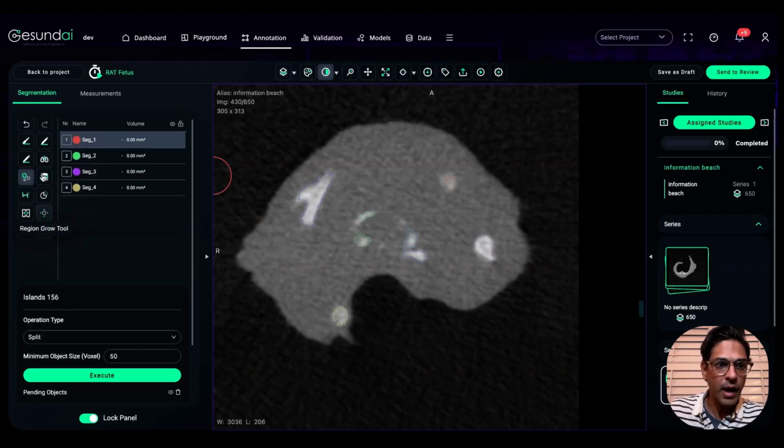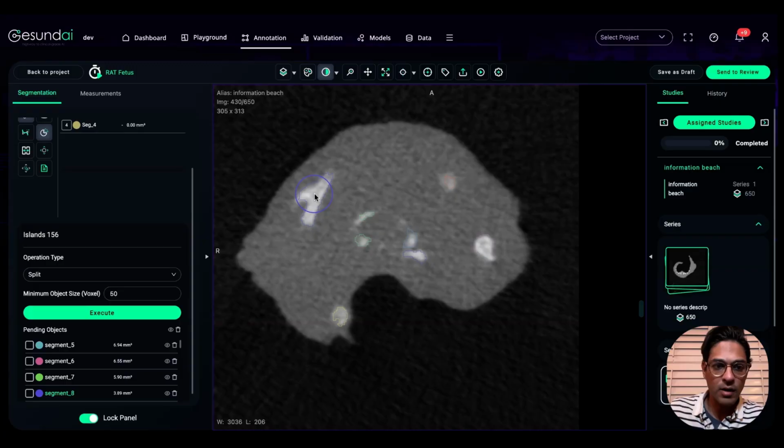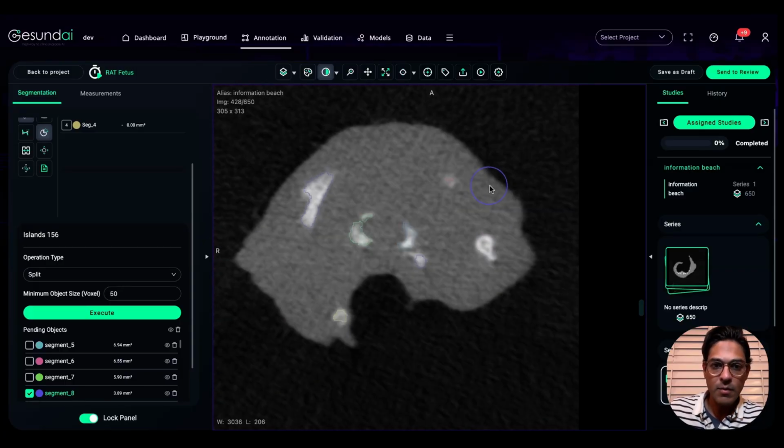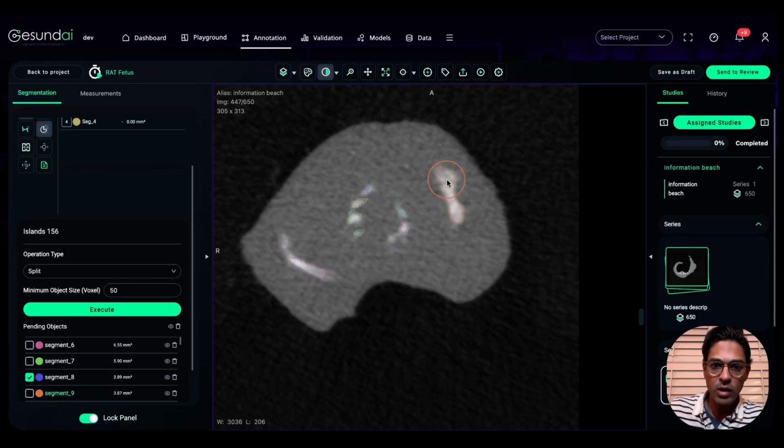And so in order to do that, we can pick our Select Segment tool that you see here. Simply hover over the anatomy. It changes color to the color of that label and highlights green, as we see here. We'll select it. And then we'll do the same thing with the other scapula. It'll highlight orange, just as that anatomy is, and the segment will highlight in green text.